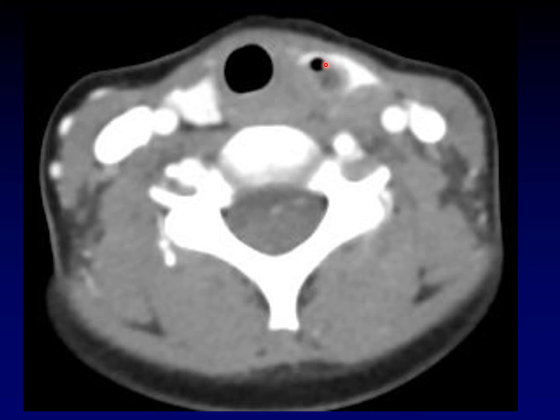Here's a picture that shows a mass inside the thyroid gland. And you might be asking yourself, why are we talking about thyroid lesions in the middle of a lecture about branchial cleft cysts? When you see an abscess of the thyroid gland, you must suggest that there could be an underlying branchial cleft anomaly. The third and fourth branchial clefts, as they travel down through the neck, go adjacent to or within the thyroid gland. There are very few other reasons to get an abscess of the thyroid gland. It's very rare outside of these anomalies.